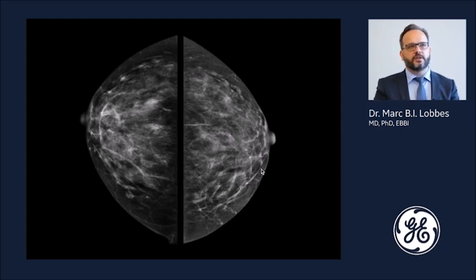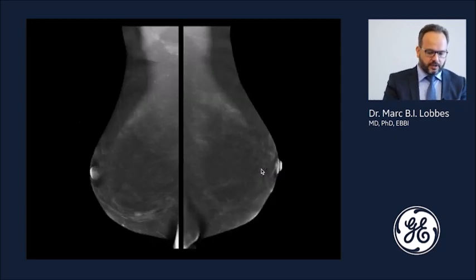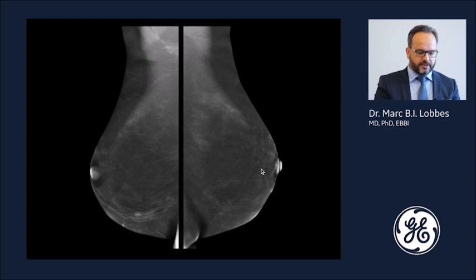You can do that as easily on contrast enhanced mammography as you can with other mammography techniques, and therefore it's also preferable, as a doctor, if it's possible, to be in the room with the technicians when you acquire the images, to direct the technicians on what kind of images you want to view. So next there are the recombined images of both breasts in two views.